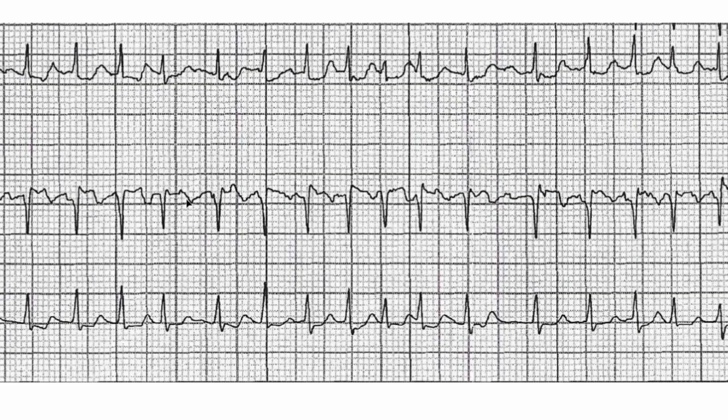When you're looking at ECGs, there's stuff you can reference in any sort of reference material pretty easily, and you can figure out what it is. And then there's this pattern recognition, which emerges with experience, with time, okay? And it allows you to better filter necessary and unnecessary information. It's really you training your eye and your mind to work in unison, to figure out more easily what indeed is going on. Look at this up here.